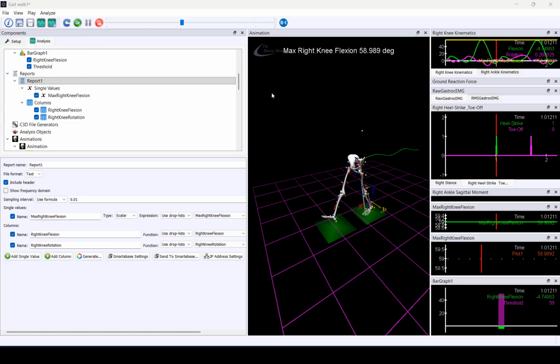Once you have finished defining your analysis variables, displaying any graphs, and have set up a report as desired, you can save all these settings as an analysis to apply onto the workspace or other activities. This makes the analysis process much more efficient, as you are essentially saving a template of your variables, graphs, reports, etc. There's no limit to the number of graphs and variables defined in an analysis, but the more that there are can affect loading and processing time.